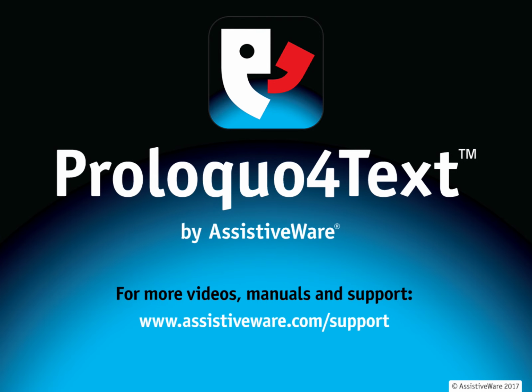This video has focused on customizations in Proloquo4Text for people with visual impairments. These are just suggestions, and it is important that a user find the right set of customizations that suit their needs.